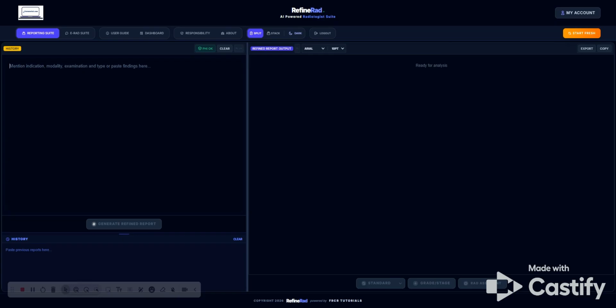We have intentionally not included voice recognition software because that was not the intention of building RefineRad. There are fantastic voice recognition softwares out there from Nuance and others, and every trust has a PACS system with VR software, so there's no need to have one more VR to dictate into an external platform. So you can either type into this box or report as you would normally in your own PACS system and copy paste the indication, technique, whatever you need into this area and hit generate refined report. Let me demonstrate with one simple case.